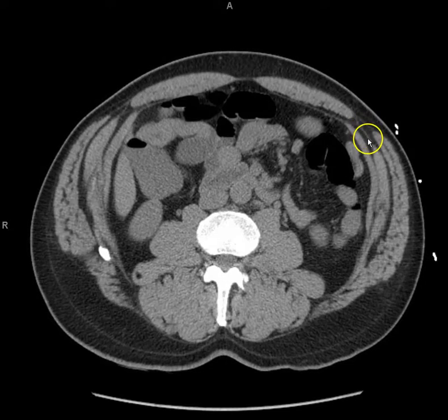You can see, okay, so here, this is a good view. You can see the rectus, right? Do you see this here? What is that? It's the posterior rectus sheath. The anterior rectus sheath is here. You can actually see it's coming together here, right? This little V. So you remember learning in anatomy what forms the posterior rectus sheath above the umbilicus?